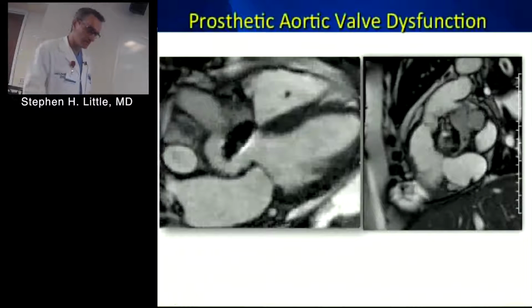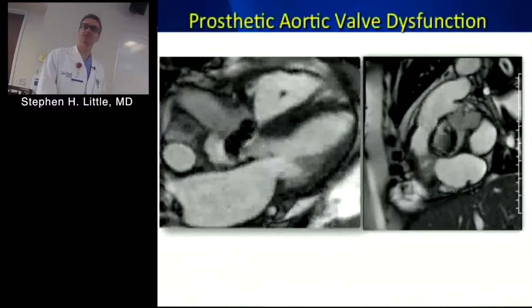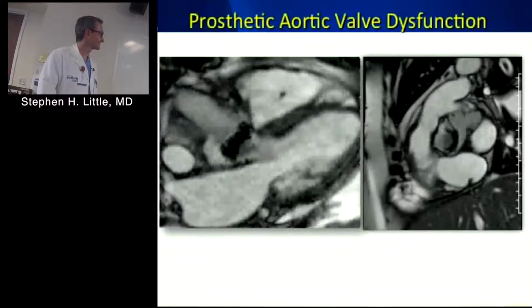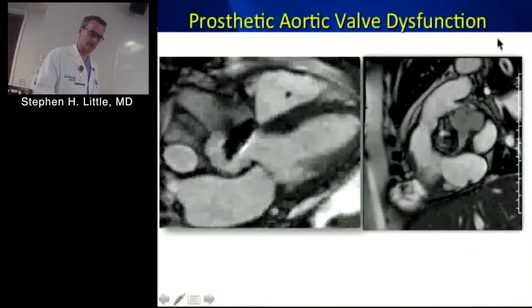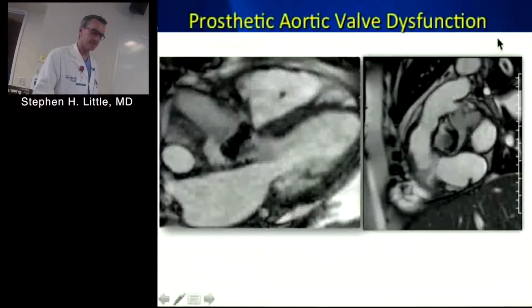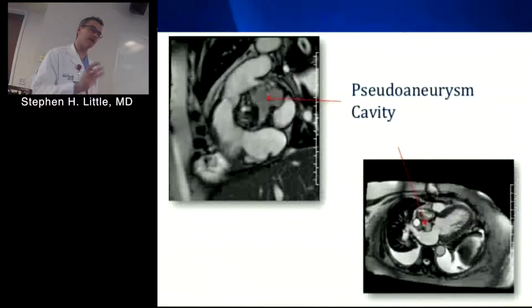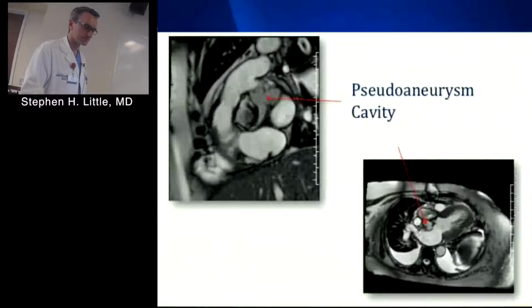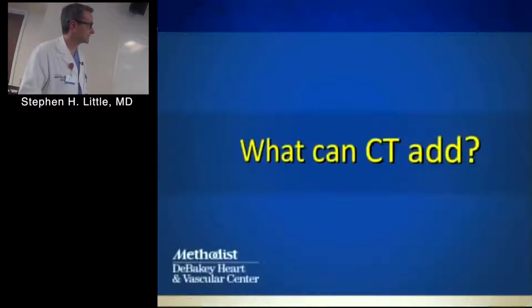Yeah, we've done a few times, but I would suggest we probably also did a CT. That's typically how we roll. But that's where it's useful. It's really the peri-aortic events and the complexity of the extent of the disease. This one has a pseudoaneurysm cavity, a very large pseudoaneurysm again, in between the aorta and the atria. But CT we do much more frequently for these.